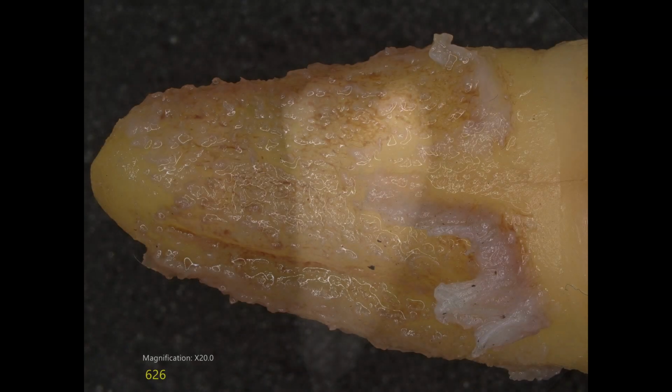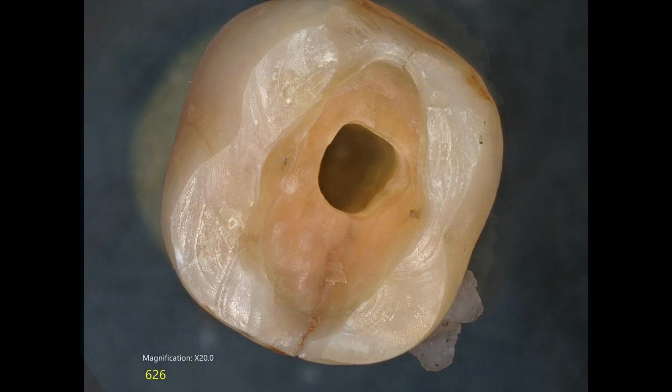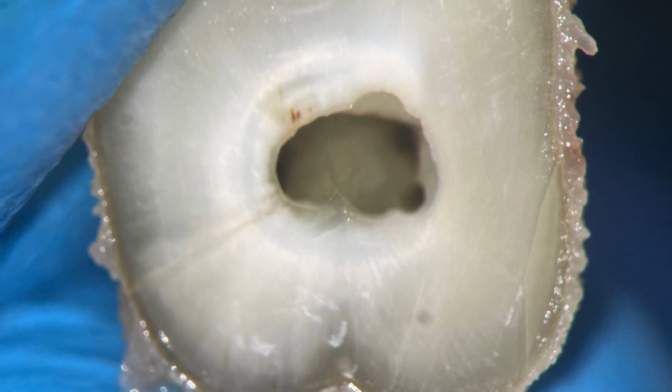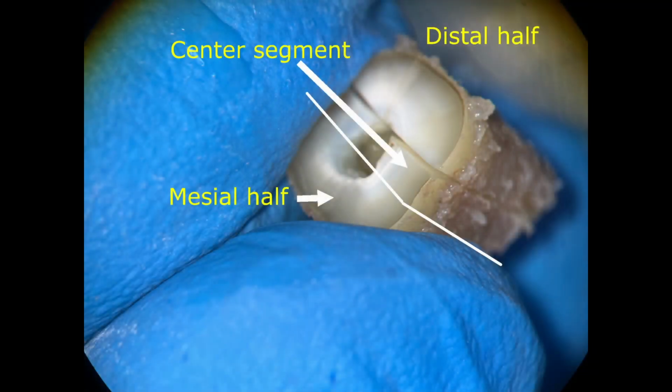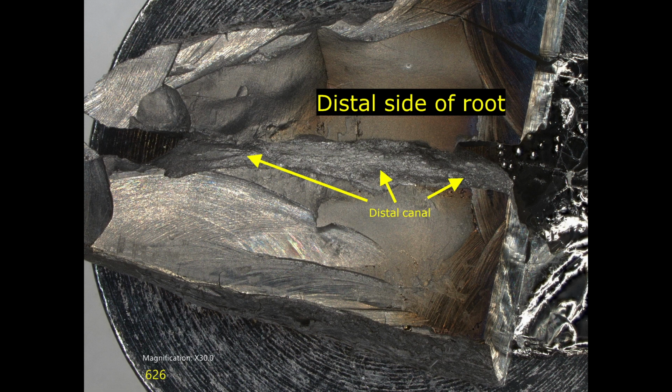These are my radiographs, and this is how I received the tooth. There was a single apical foramen and a stepped minimal access. The crown was sectioned, but no pulpal floor fracture was detected. As mentioned in the initial report in the last tutorial, the common terminus presented problems in sectioning, and it was decided to section a central segment and image both sides of that segment. This is the mesial side of that segment, and this is the distal side of the same segment.